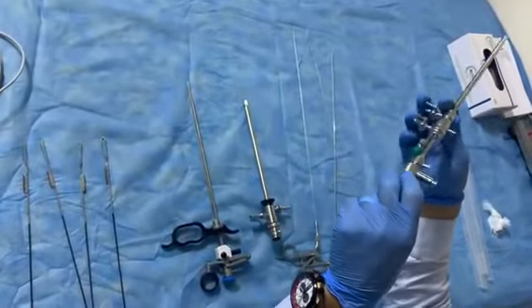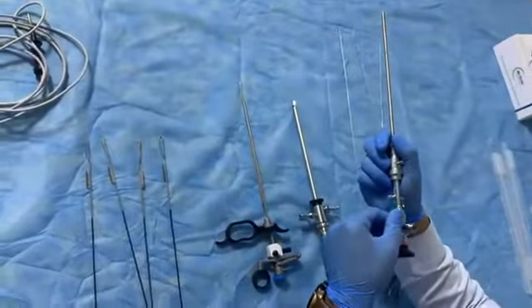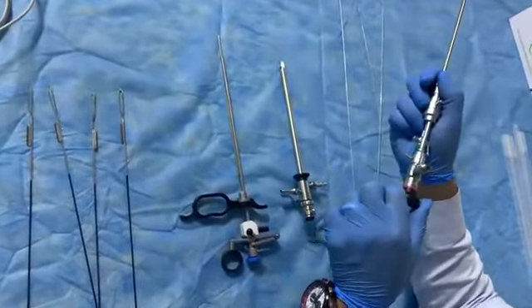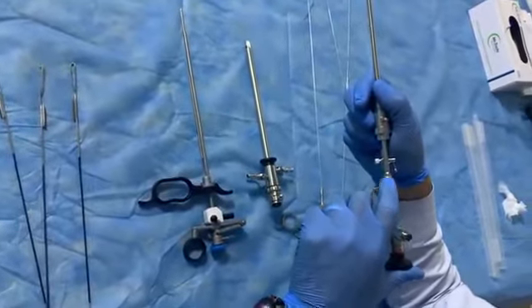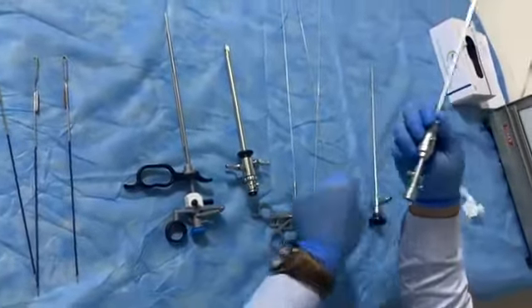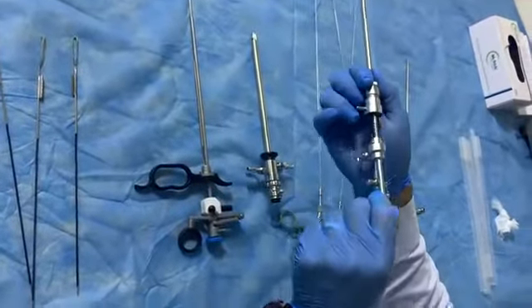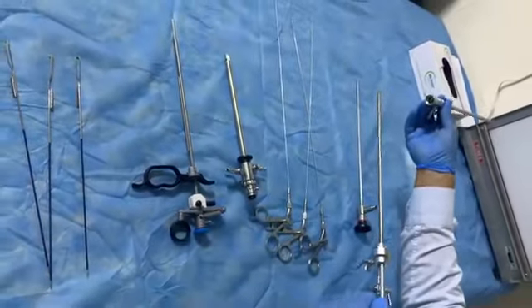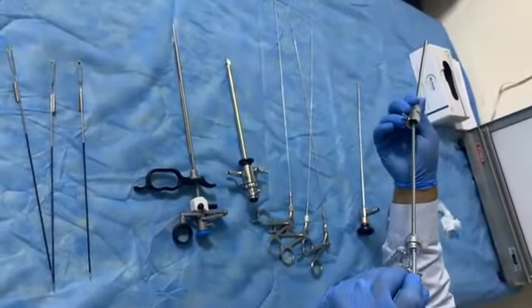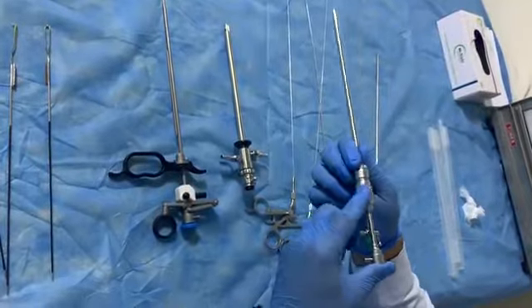So this is the therapeutic and diagnostic hysteroscope. Don't forget, the lines should be parallel to each other to be separated. Now this line is parallel to this line. Now the telescope is out. And this line should be parallel to this one to separate the telescope. When we want to fix it, the lines should be parallel to each other and turned clockwise to close.